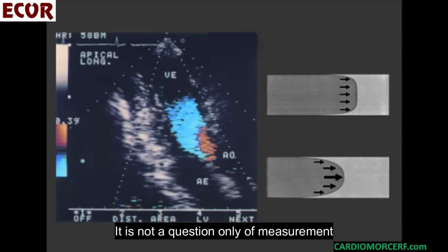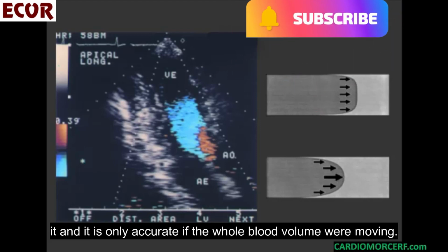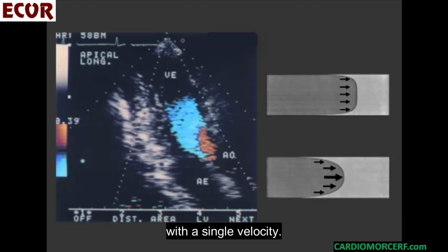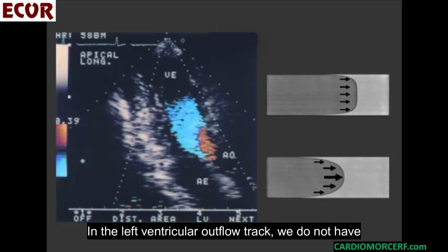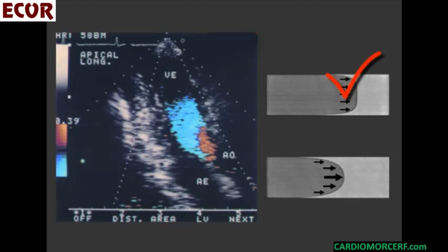It is not a question only of measurement, but also the fact that you cannot take any velocity to represent the VTI, since we're talking about volume here, and it is only accurate if the whole blood volume were moving with a single velocity. In the left ventricular outflow tract, we do not have a flat front of velocities where all are equal, as seen here.